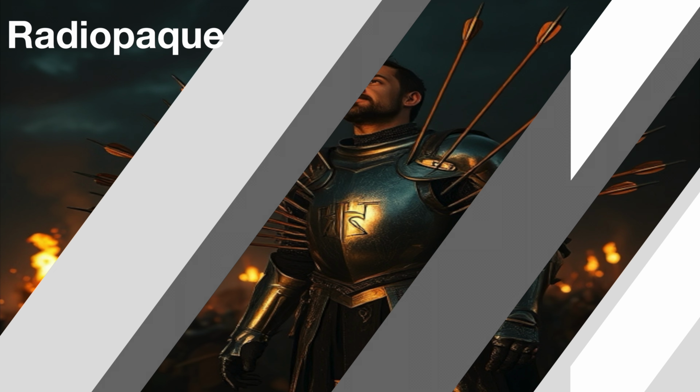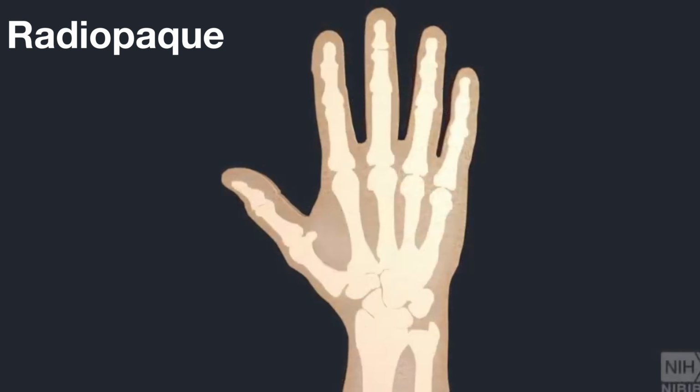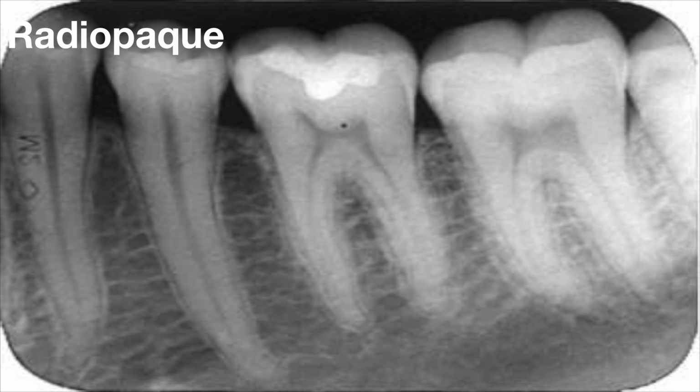Radiopaque materials are the heroes that block X-rays. They don't let X-rays pass through, and that's why they appear bright white or light gray on the radiograph. Real-world examples appear on the IOPA, highlighted one by one.